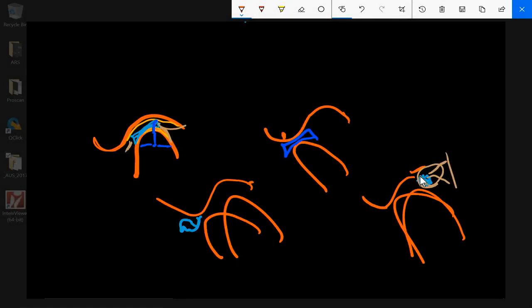So we've got complete derangement, partial derangement, closed lock, open lock, American Dental Association criteria for displacement in the closed mouth view as a starter set for interpretation of the TMJ. You ready to get started?